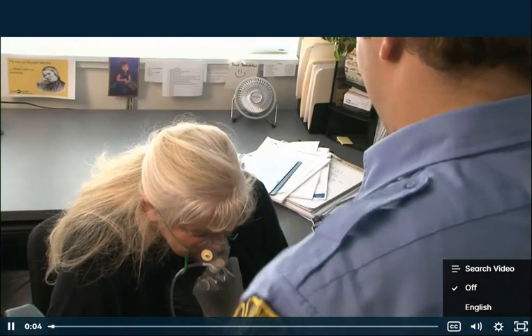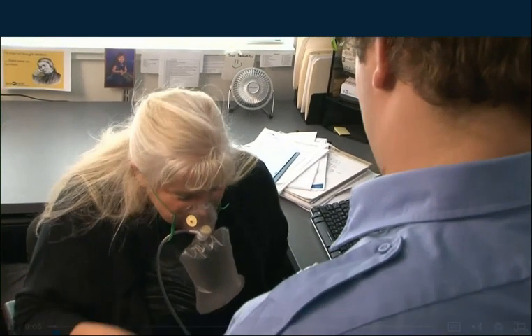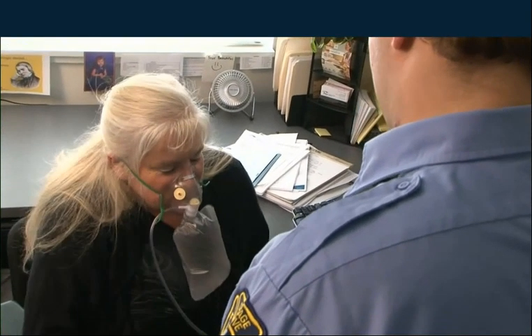Capnography is very effective for determining if treatment on a non-intubated patient has been effective. When I first started using capnography, I put it on every patient. Did every patient need capnography? No, but I put it on so I could start to identify changes that I was seeing and what was concerning and what wasn't concerning. As I progressed, I started to modify the patients that I used it on, in cases that I really wanted to identify those 3 key issues: metabolism, perfusion, or ventilation.